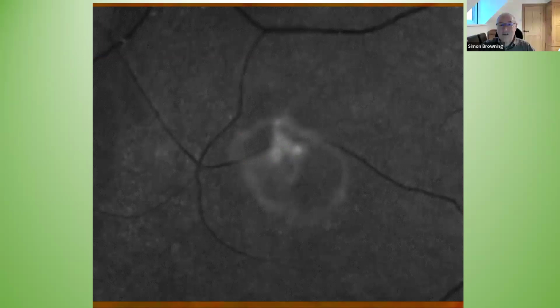My daughter was 16 when this was taken, and she was nearly 17. She was just due to go off to Australia for the best part of a year, and this was 2 days before she flew. She popped in and I saw this. Downloaded it onto her phone and said, look, if you have any problems or symptoms while you're out there, then do take this image along with you.